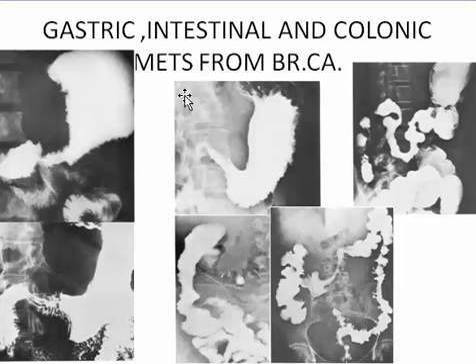Gastric, intestinal, and colonic mets from breast carcinoma. This is gastric subserosal deposits, resulting in an appearance similar to linitis plastica. So linitis plastica is not necessarily from inside as gastric carcinoma, but could be due to subserosal deposits invading the wall. Subserosal deposits invading the colon.